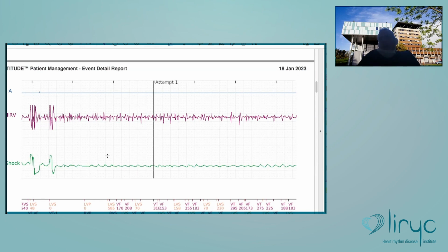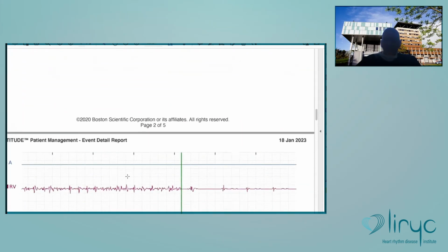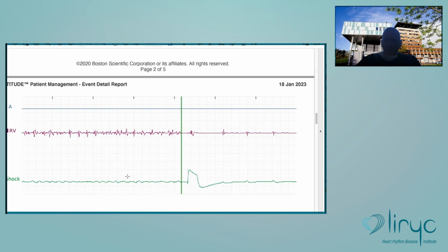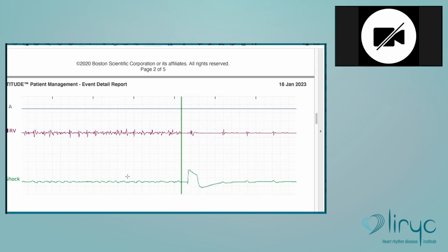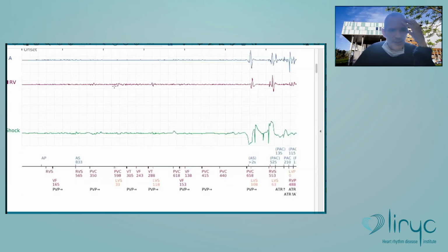an electrical shock. Really, I think it's a better idea to deprogram the ICD for the surgery and use external shocks in case of VF, because you will drain the battery, and I don't think it's useful to see this kind of tracing. Okay? But at least you need to know this typical aspect: flat, and then this, because sometimes you receive this tracing with remote monitoring and you don't know that the patient had a cardiac surgery, and it's really typical. Okay.